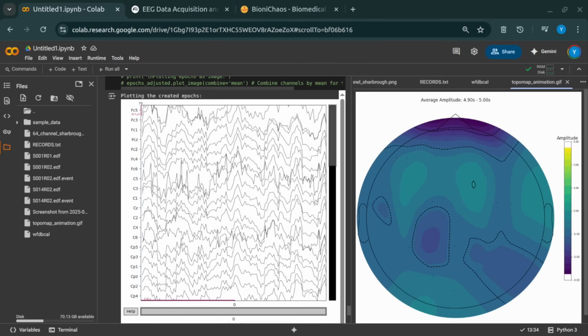That dropped epoch led us on a deeper dive into the raw.event files themselves. These were separate files alongside the main EEG data. We discovered they contained custom binary data, not just plain text. Binary, never fun. Tell me about it. And it also mentioned a time resolution that felt a bit unusual, 160 units per second or something like that.